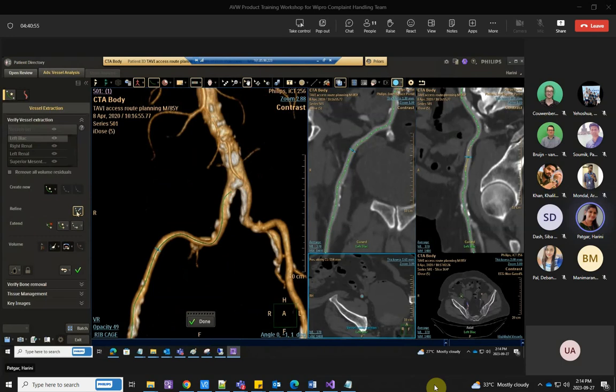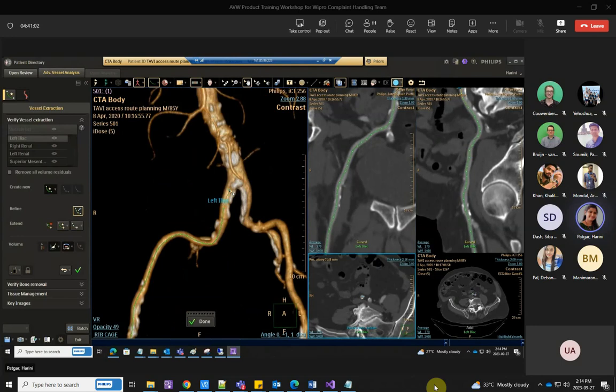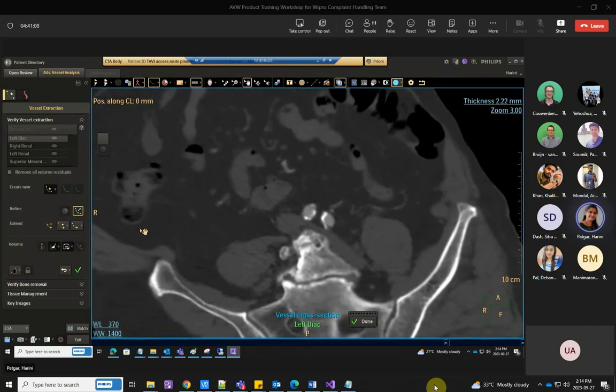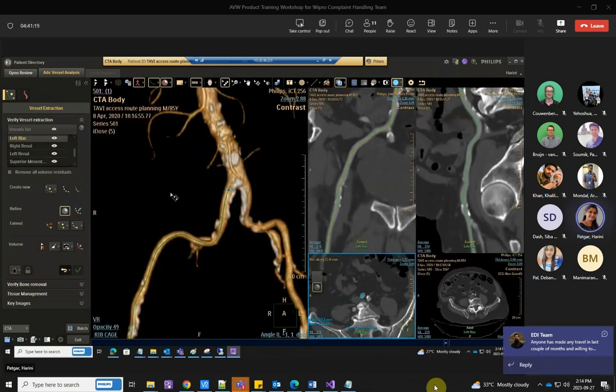Okay. So when I'm refining, I am trying to adjust the center lines in the correct position, so that the cross sectional image over here, what I was seeing, will actually get a proper run through. So accept. So yeah, this is about the tools here, and extend and volume and all. This extend is again one of the refinement options only.